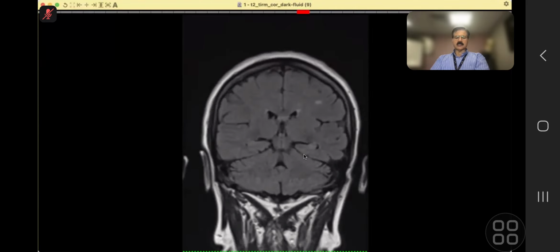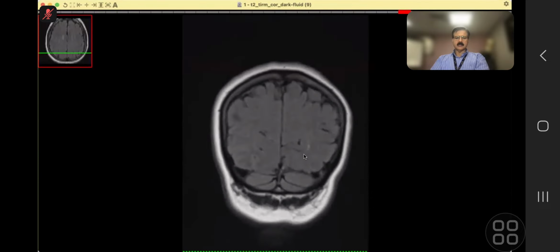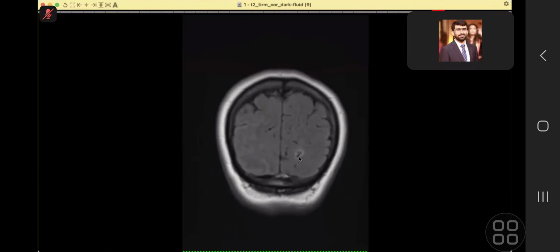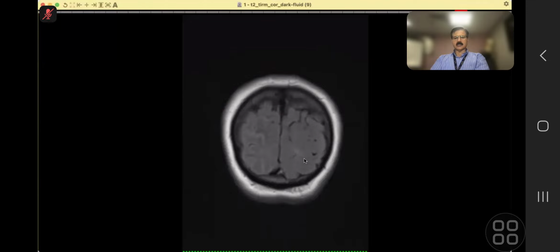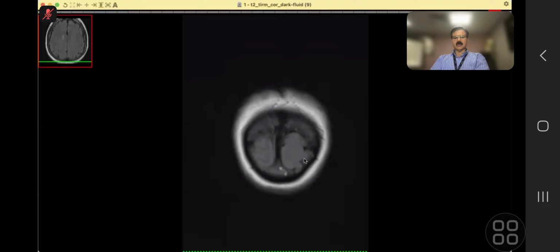Go posteriorly, please. So here, this is the hyperintense. I have told you this is not a sulcus. You are mixing up.